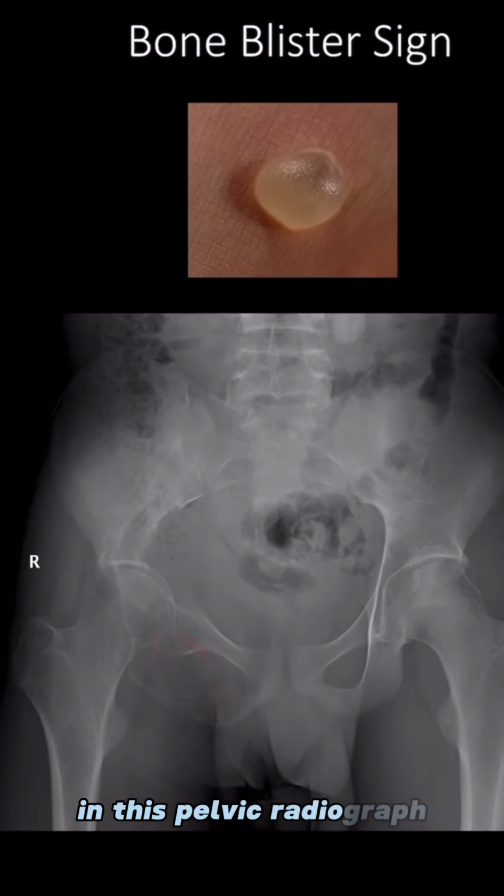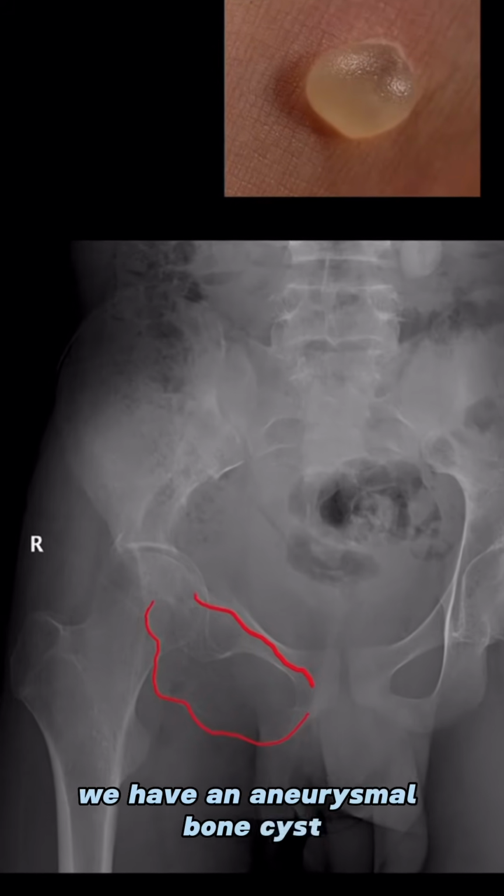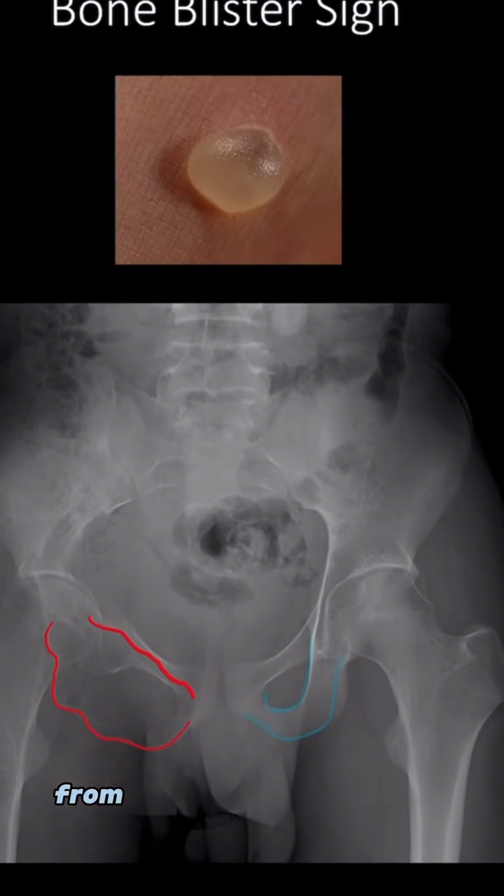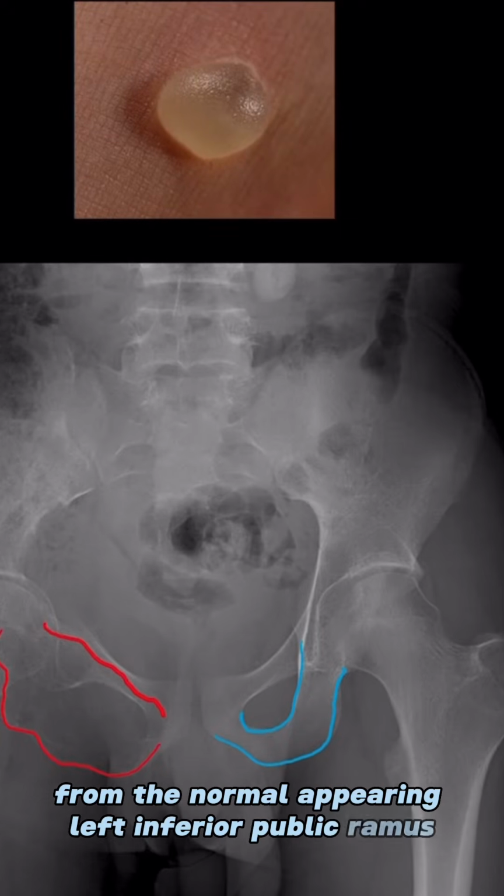In this pelvic radiograph, we have an aneurysmal bone cyst centered within the right inferior pubic ramus, which looks very different from the normal appearing left inferior pubic ramus.